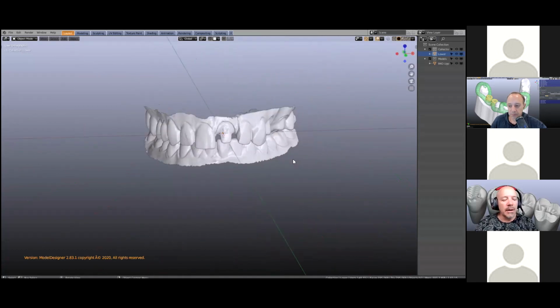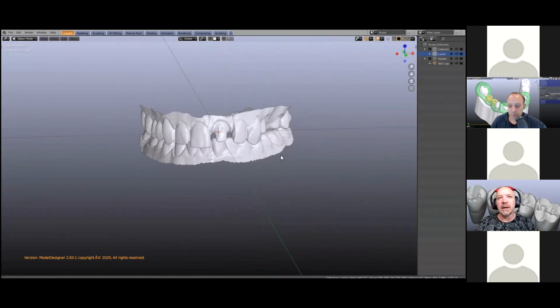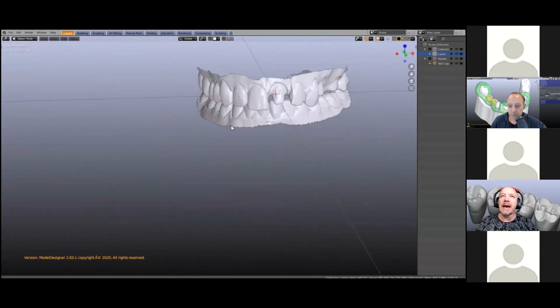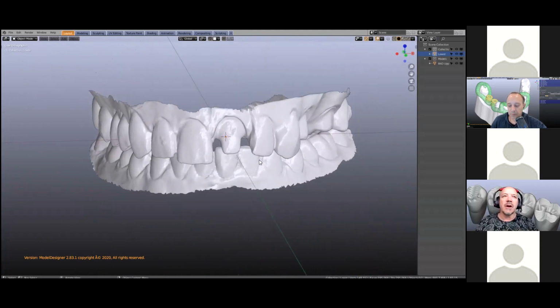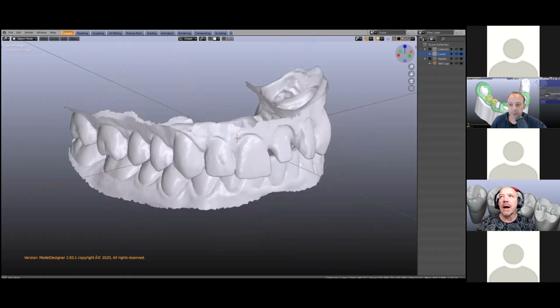And the third one is by pushing down the shift key and the mouse wheel at the same time, we are panning across. So sometimes when you first start CAD, it's very difficult because you multitask. You've got to zoom and shift and pan and whatever at the same time. I'll demonstrate soon.